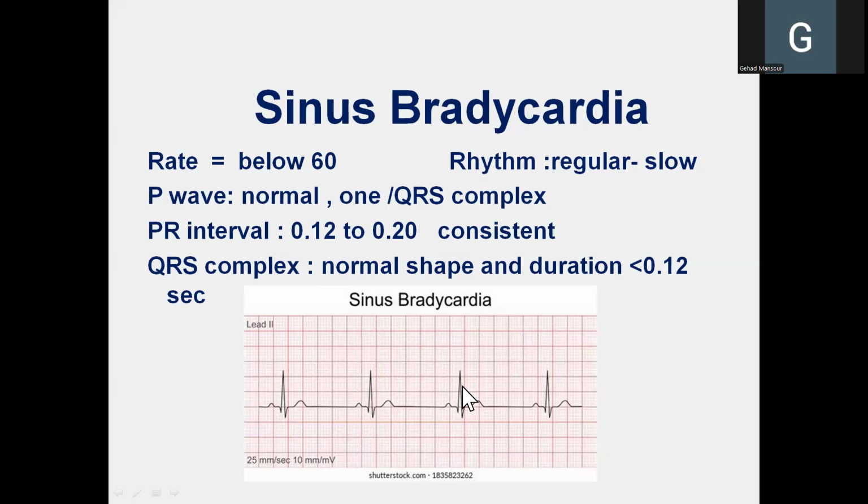Again, because the ventricular depolarization occurred normally and the spread of electric activity across the ventricle started at the AV node and spread over the myocardium in the normal direction, then the QRS complex will also be normal in shape and normal in duration. And the normal duration of the QRS complex is when the total duration is less than 0.12 seconds, or 3 small squares.